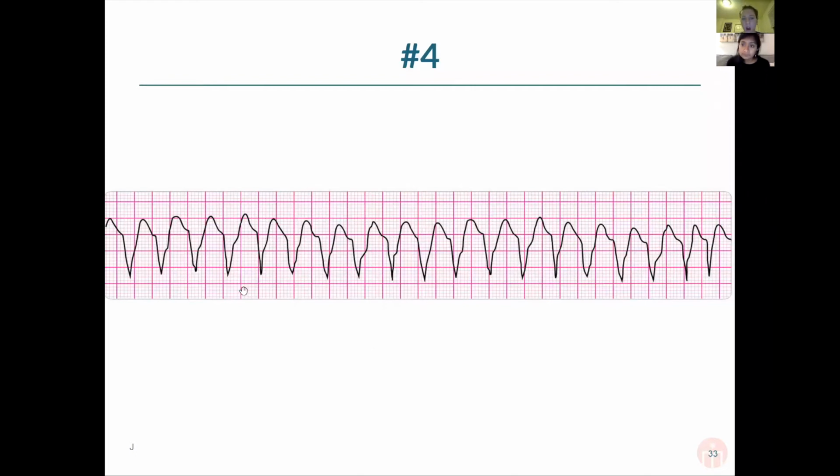It's pretty high amplitude. It's not just puttering along like we had said before when we mentioned VFib. So that gives us a little bit more of a differential. And so what we're really seeing here is a classic example of ventricular tachycardia. All the QRS complexes are going in the same direction. They're wide, they're fairly similar in shape and morphology, and so this is a very classic example of VTAC. A VFib type of picture will be much more fine. It's not going to be quite as large amplitude and pronounced as this.